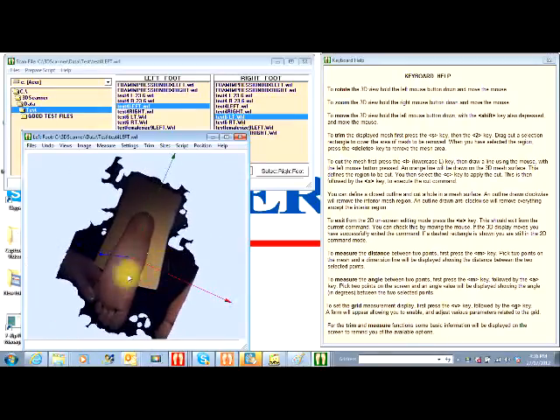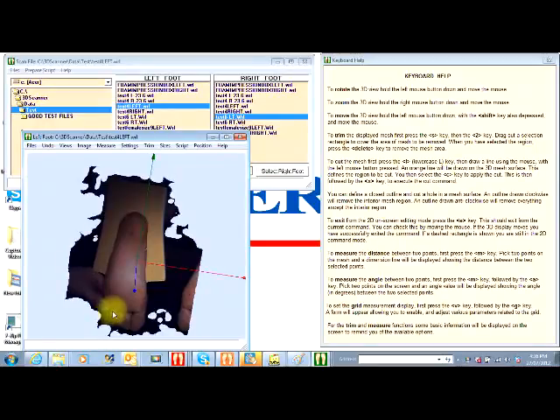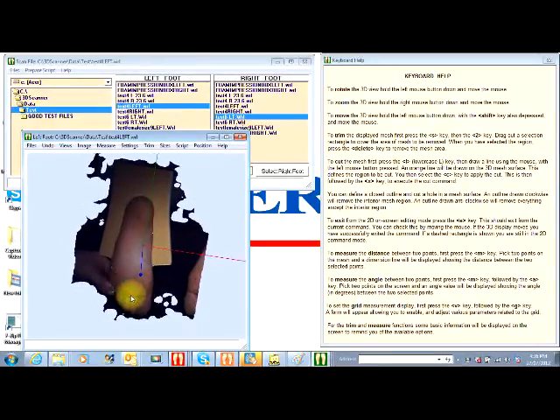This is how the foot is sent to us. This is how we like to see the foot. But because we're a lab, people just send us the foot and then we trim and clean it up. If they're doing it in-house, they'll need to do this themselves. We have different commands that you can use.